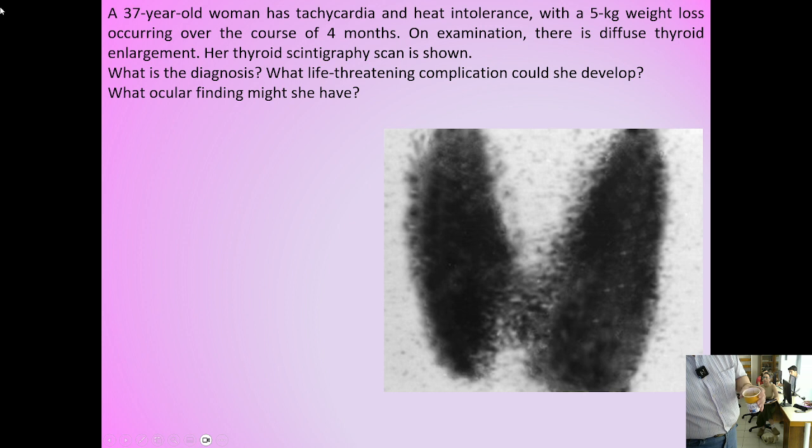So this is the scintigraphy. What is the diagnosis? A life-threatening complication having to do with one of the syndromes. If we have primary hyperthyroidism, this is Graves' disease.